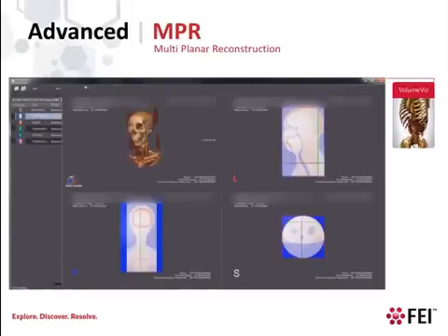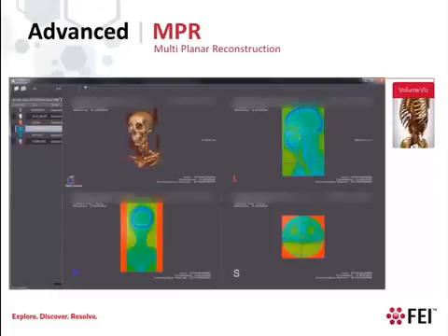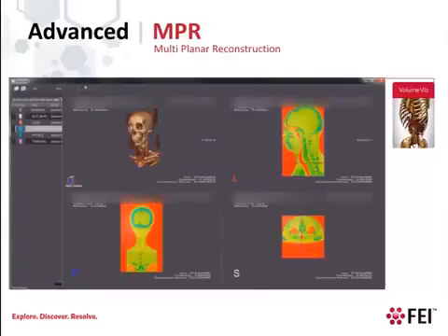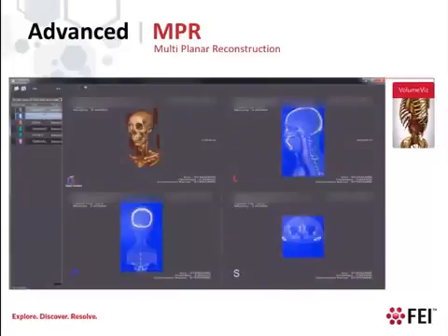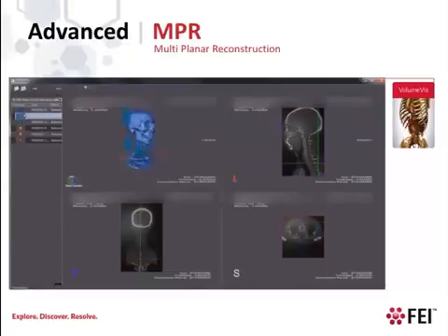Volume Viz provides features to manage the transfer function. Here we're selecting some of the predefined color maps embedded in the product. Of course, you can load your own color maps and create color maps programmatically. Here we're handling input events so that dragging the mouse horizontally and vertically modifies the min and max values of the color map. In an intensity or grayscale color map, we could use this to change the window level or contrast and brightness. Next, we'll do the same thing in the 3D view. Using GPU rendering, modifying the transfer function is fast and interactive.